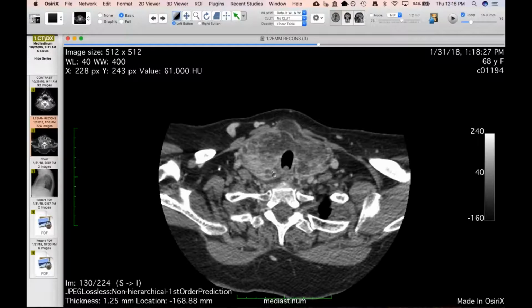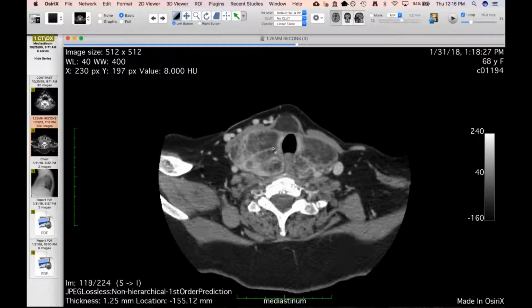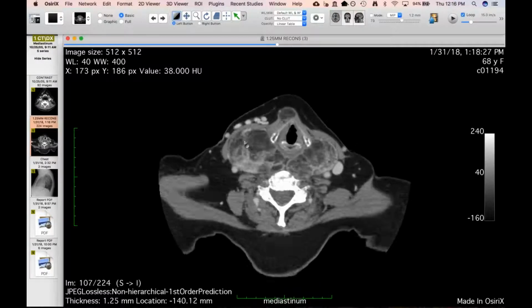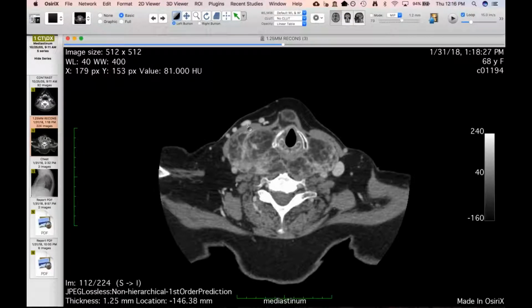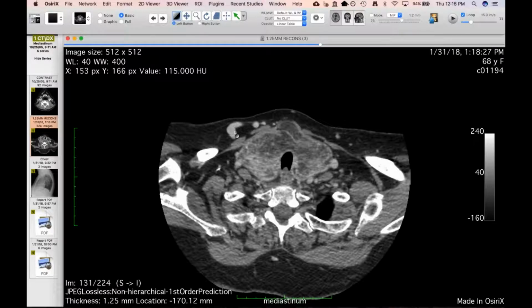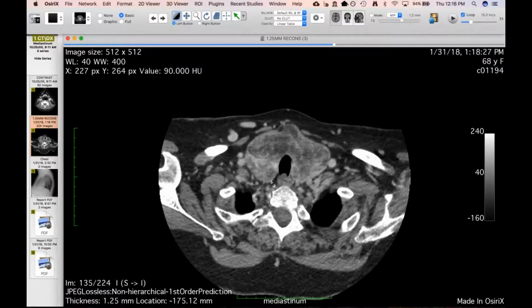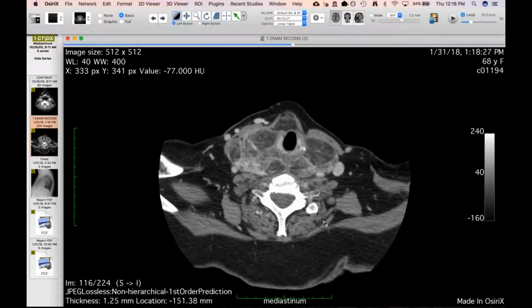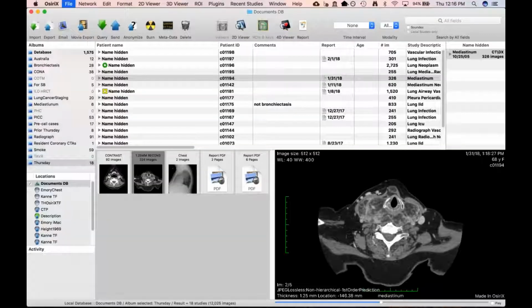In the prior patients that were biopsied, these were all normal thyroid, just interspersed with mature adipose cells. So I don't know. We'll see. And she had the neck mass, but I think my resident was saying that she was coming in with venous congestion. You can see this dilated right external jugular vein, and there's some narrowing of her internal jugular vein in this area. So yeah, collaterals. But pretty interesting.